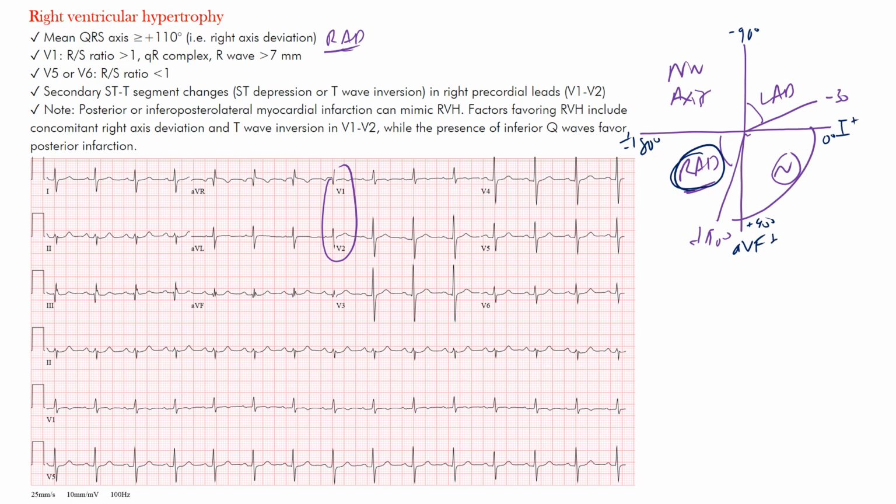So if you look at lead 1, its positive end, and AVF, let's take a look at them here. So lead 1 is this. If you were to draw a line at the isoelectric or baseline, you could see that it is mostly negative, okay? Still mostly negative, going away from lead 1, okay? And then if you look at AVF, AVF's QRS complexes are mostly positive, putting us in this region here.